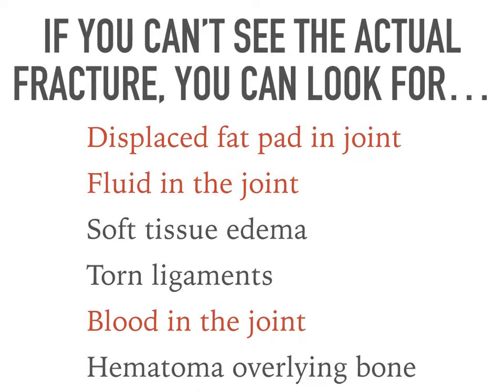Now, 3 of these findings don't help us with long bone fractures, not that we needed that much help anyway, but they do help us with fractures that extend to within a joint capsule, such as a supracondylar fracture. Did you like that segue?